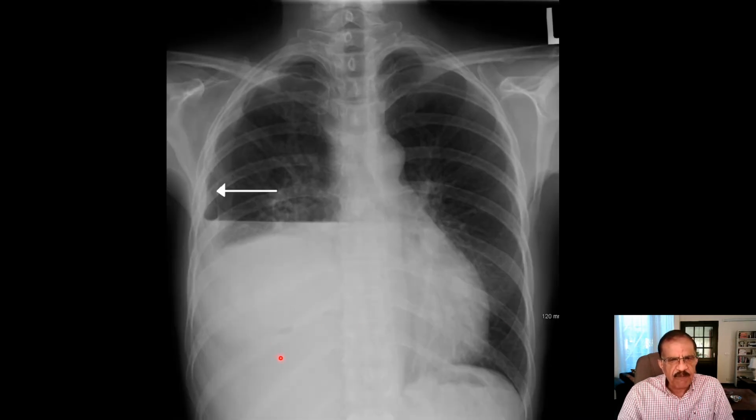Now this is again pleural effusion, but you see two things. Let me see if you can pick up. I'll give you a few seconds. See if you can. Of course, this is opacity, very similar to the one we saw earlier. Uniform, homogeneous, no lung markings, no costophrenic angle, no diaphragm, no cardiophrenic angle, no right cardiac border. But in this case, there are two differences.